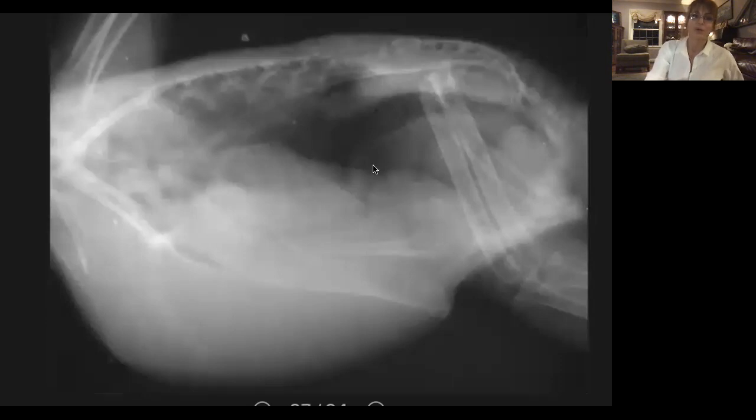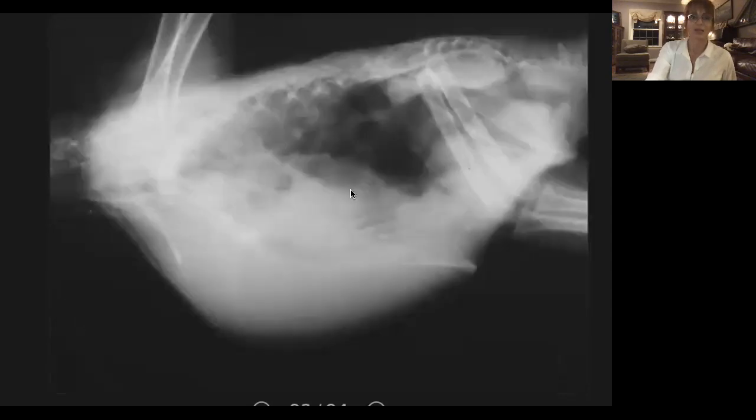And this is a little more mild case, so I put up the more severe first, just so you kind of get an idea. We can see our proventriculus there, right, going down into our ventriculus, but then we have this kind of funny line right here. So you can actually see the division between the two air sacs, and here it's a little bit more severe. We can still kind of find our proventriculus, but here's one division between air sacs. There's another, these are just kind of granulomas up in there, but you can actually see those air sac lines.